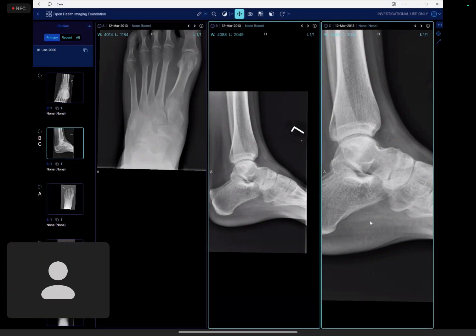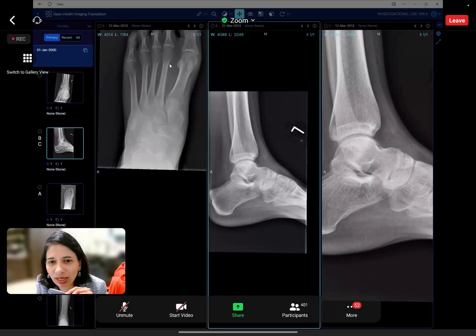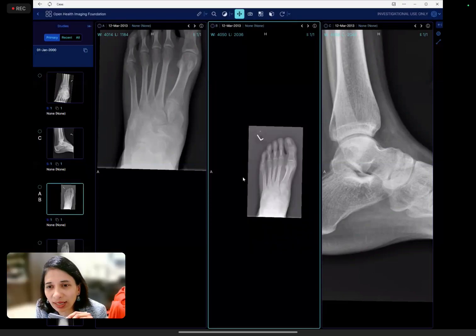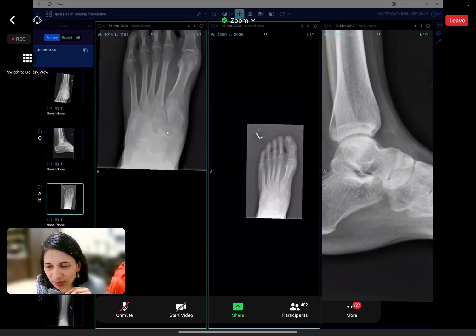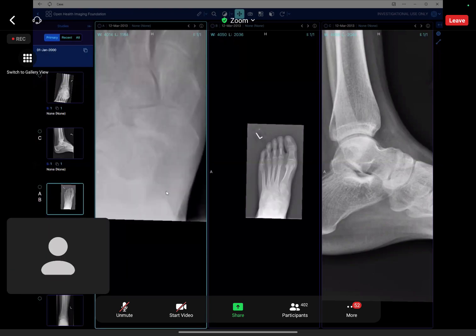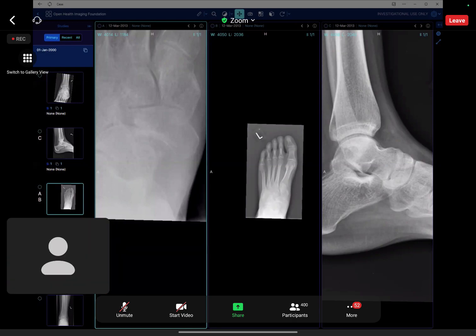So I thought I'll show you the radiograph as well, and the subsequent radiograph when it was done, and you can see that this is your clue. See, this should be here. It should not be empty. And also, young patient jumped from height, so you're looking for trauma. Okay. So those are the clues.